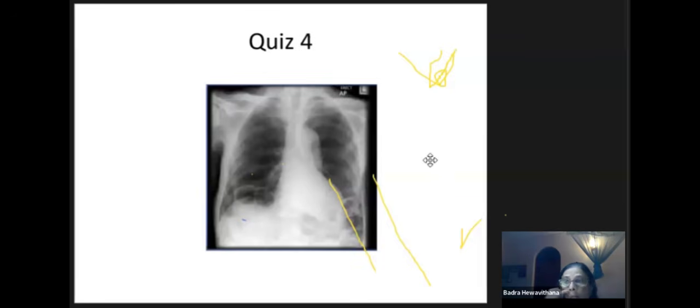What about this one? Have you seen this before? I'm sure you would have seen. This is not pneumoperitoneum or gas under the diaphragm, but you can identify these large bowel loops going in between, interposing between the diaphragm and the liver. So this is the so-called Chilaiditi sign, Chilaiditi syndrome, or whatever they call it. When you see it for the first time, you take a step back. So don't do that. Just be aware of the Chilaiditi sign.